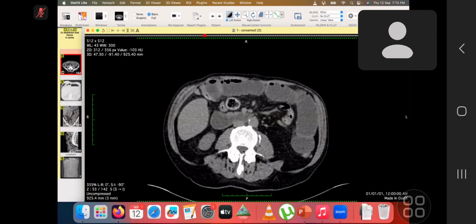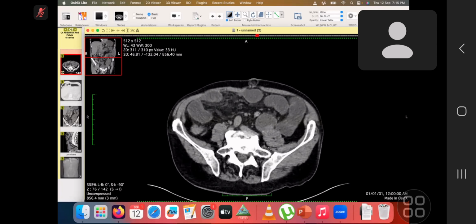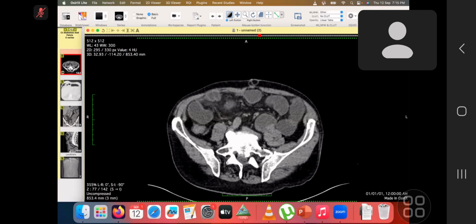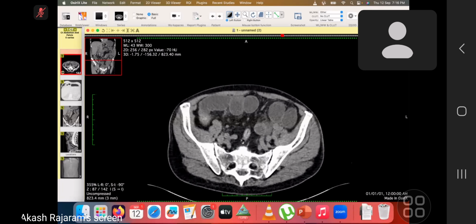superior mesenteric artery. So overall findings, small bowel dilatation with a calculus in the pelvis raises suspicion of a gallstone ileus actually. And I could also see that the gallbladder was contracted with air within. This could represent a cholecystoenteric fistula with a stone which has been translocated to the pelvis region. This would represent a gallstone ileus. In concurrent finding of a right inguinal hernia as well.